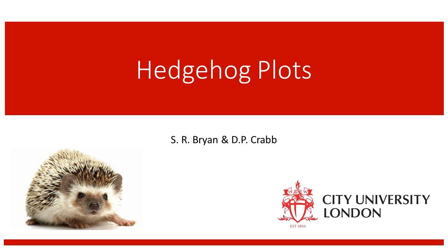The purpose of this video is to illustrate how the Hedgehog tool can be used to prioritize clinical care. I will show this using a demo dataset, and then I will show you how to upload other datasets so that these analyses can be done for data within your own clinic.